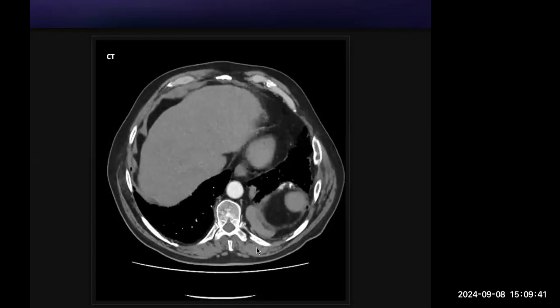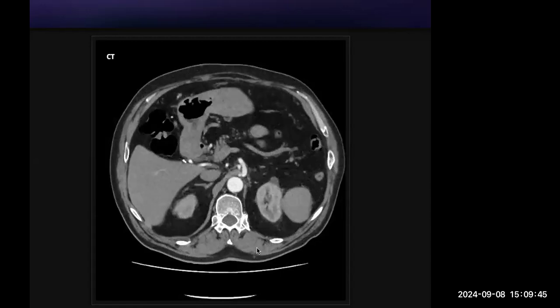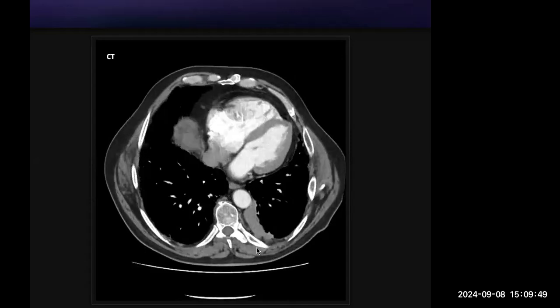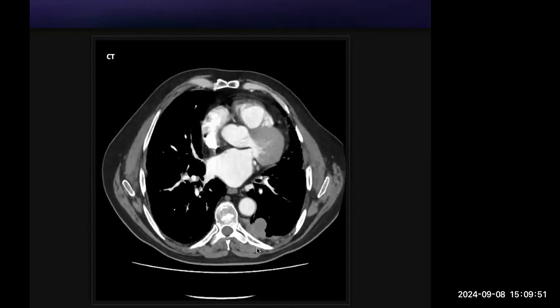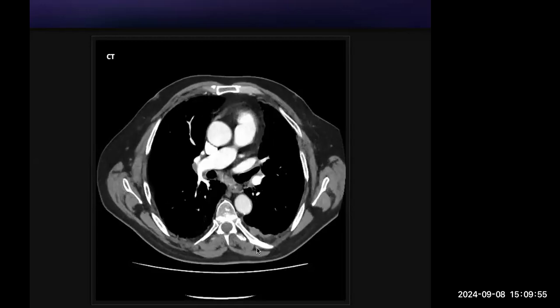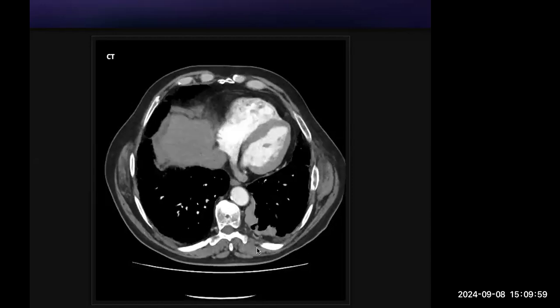So in this patient who has previously presented with trauma, I would be thinking first in terms of splenosis, because the density also appears similar to the spleen. Another possibility could be hematoma, organizing or residual organized hematoma, because the patient has had previous fractures in the rib.